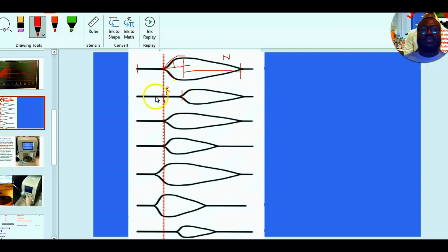So here, clotting factor deficiency, or a patient on heparin or any anticoagulant, can happen. However, the time it took for lysis was okay, and we can say that this height is relatively shorter, but we know the problem is already here on the clot, so we can't really base it on platelet insufficiency or thrombocytopenia. So here, there is either clotting factor deficiency or there are inhibitors, like heparin.